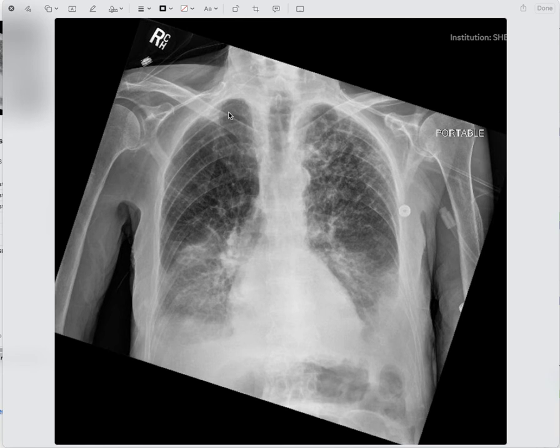So starting with A, here's airway coming down. And looks like this is probably carina right about there. And you can see the aortopulmonary window right here. And the carina is usually right somewhere in that area, which helps you locate it as well. And of course, you can still count down the vertebrae. T6, T7, T5, T6 area is usually where you find the carina.